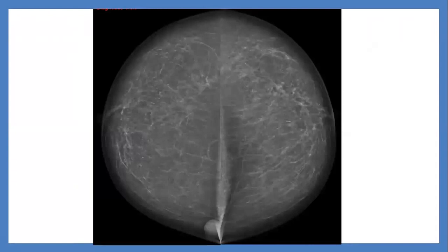Okay, let me see this case. What's your impression here? What is the abnormality?